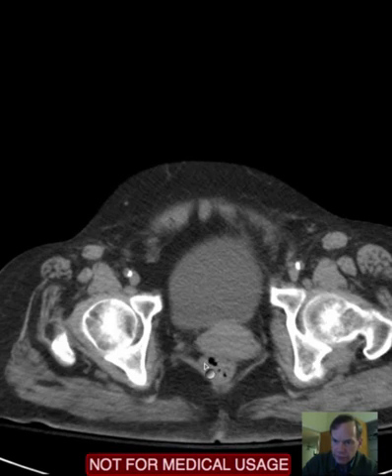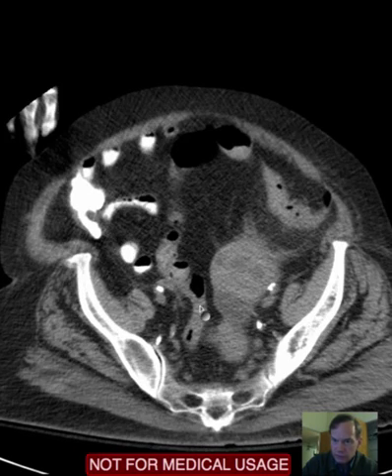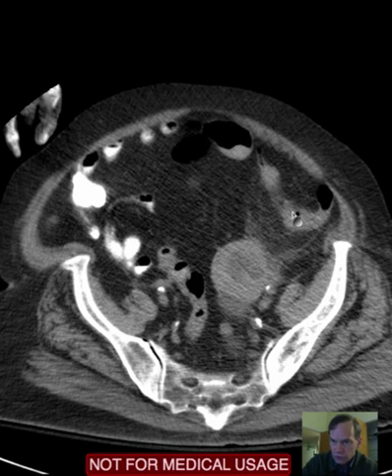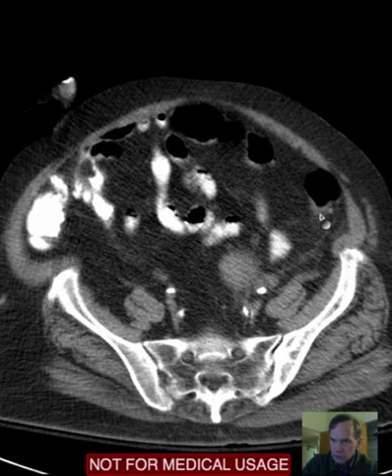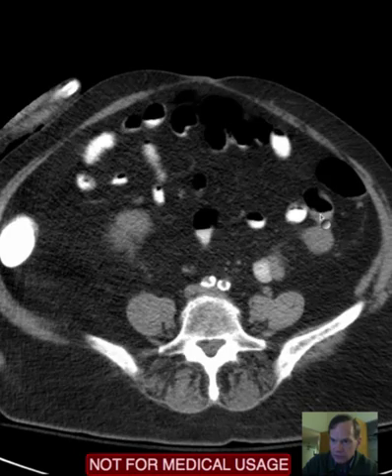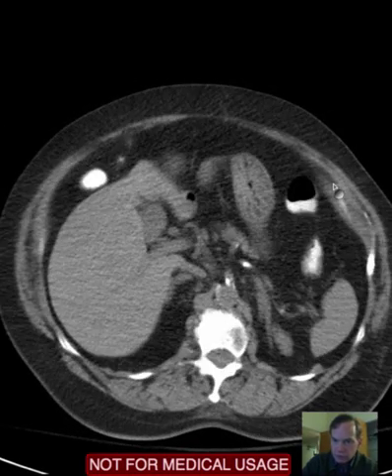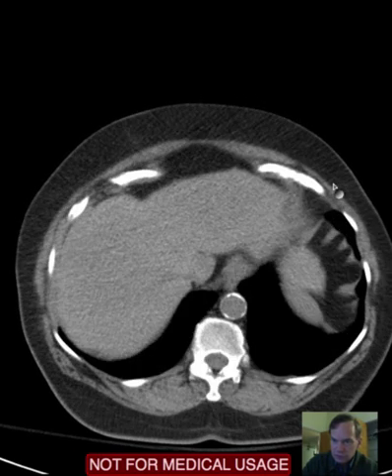And here we have rectum, and we can follow bowel reasonably well. Here we have the sigmoid colon, rather tortuous. Here we have the proximal sigmoid colon affected by that epiploic appendagitis. We can follow the colon back. Another way to evaluate bowel is to start it proximally and follow it distally.